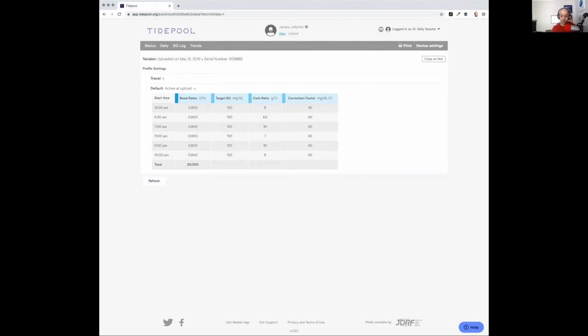Last one in from Deb. Can you see multiple days on top of each other in order to quickly identify patterns? This, unfortunately, is the most requested thing about Tidepool Web. We call this internally our stacked daily view. Just bringing you all kinds of lingo today.